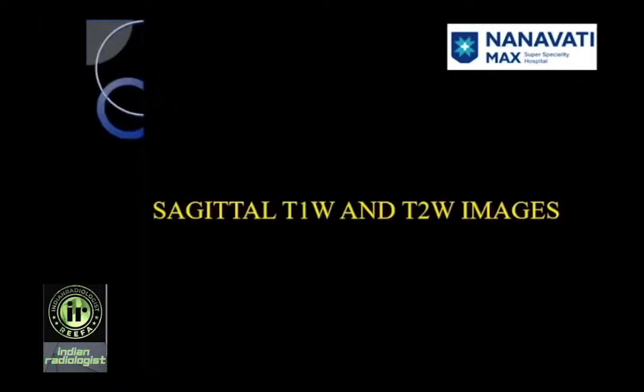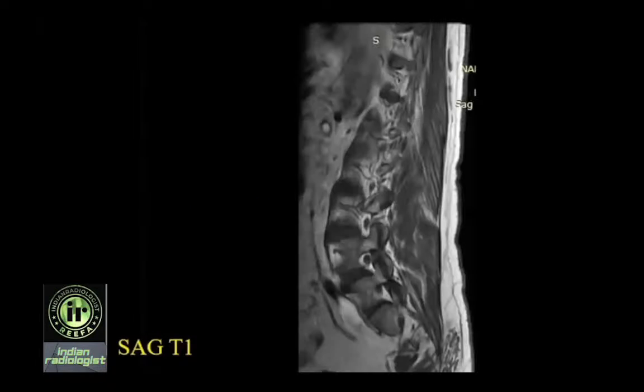We will review the sagittal T1 images again to understand the anatomy. So we obtain 4 mm slice thickness cuts from left to right. You can see pedicles of L4 and L5, the neural foramina and the exiting nerve roots. This is L4, this is L5.